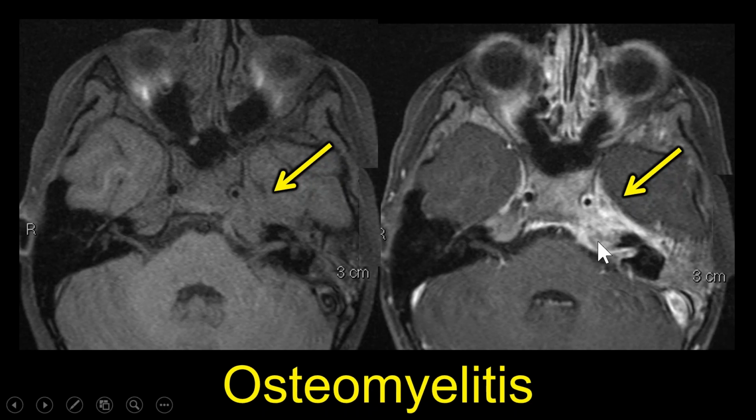And I see all this enhancement kind of in the petrous apex on the side and into the cavernous sinus, into the trigeminal cistern or Meckel's cave, and extending back to the middle ear itself. And we actually see the black ghost of the ossicles on that side, and a lot of dural enhancement extending into the internal auditory canal, then extending along the back of the clivus.